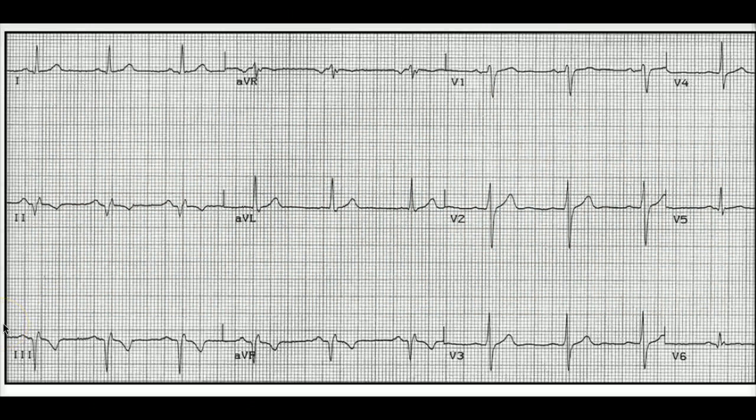So this is our last example for our Q wave. We can see that in lead 2, they're starting to build our Q wave. Lead 3, whoa, look at how big these Q waves are. Again, an old infarct. And we should also see that in AVF. So whenever we're looking for Q wave, I usually look at 2, 3, and AVF. But we also see Q waves in other portions, depending on where exactly the infarct is.